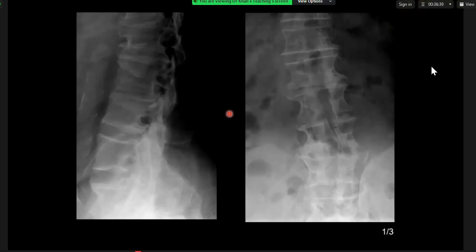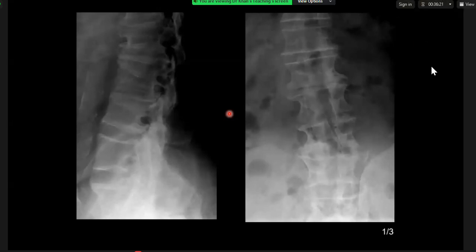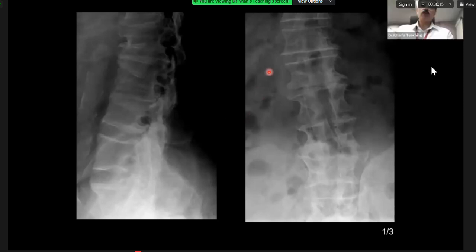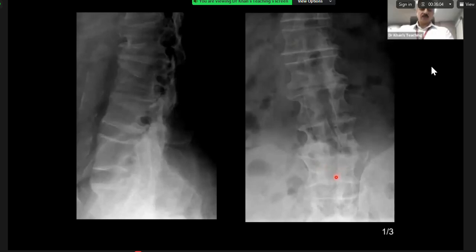Are they quite widely spaced? So your thinking is correct, and so a slight bit of fine touch is needed. Spacing is what we are talking about. Is the spacing normal or abnormal? This is the discussion. So if you see the distance between this pedicle and this pedicle, this pedicle and this pedicle, it gets progressively narrower as opposed to getting progressively wider. So have you got your diagnosis then?